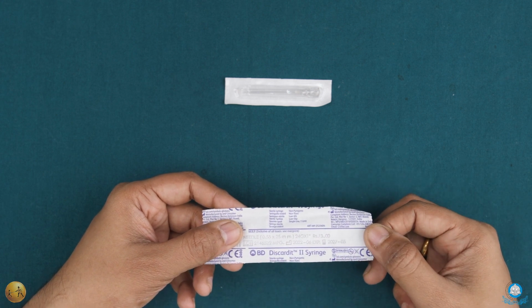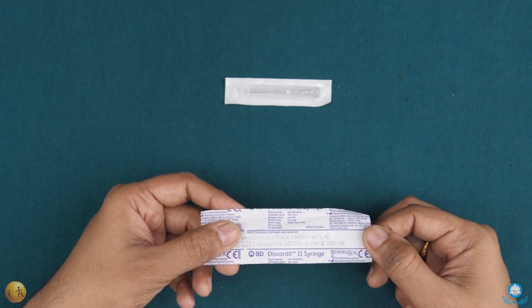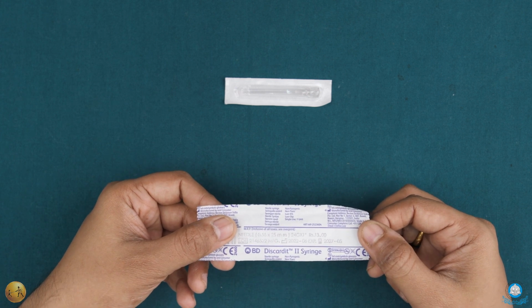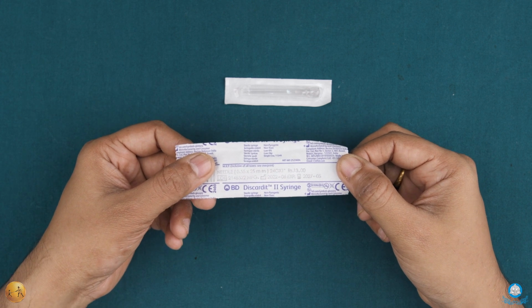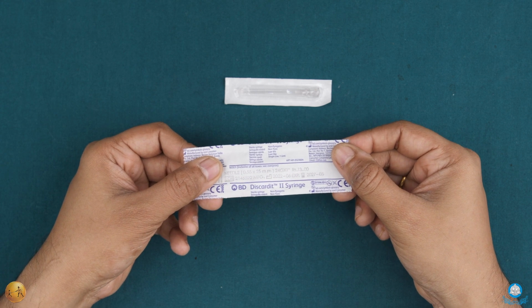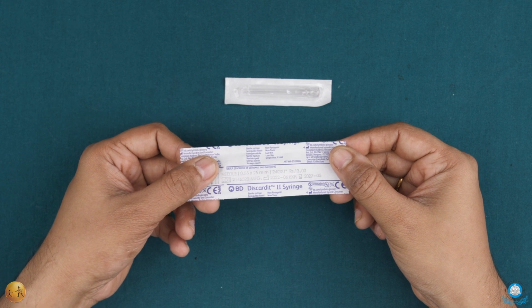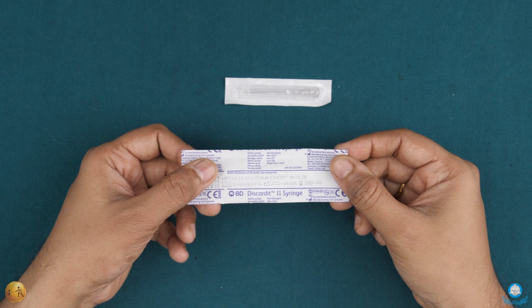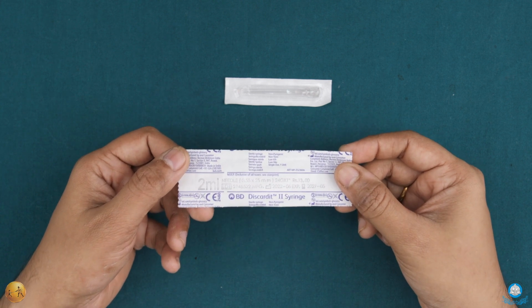where you see it says sterile syringe and it says non-toxic, non-pyrogenic. What that means is that this instrument or this syringe in particular is not capable of producing any fever, or it is devoid of any antigens that may cause fever-like symptoms. So that is what it means when it says non-pyrogenic. Non-toxic obviously refers to the toxicity of the material itself. So it has been tested and proven that this is a non-toxic syringe.